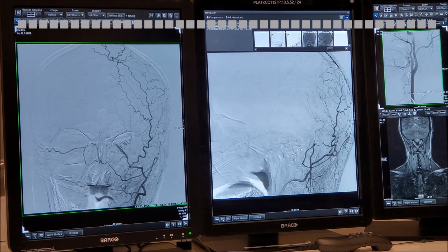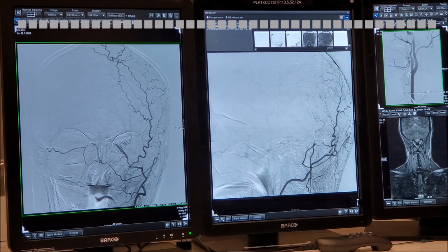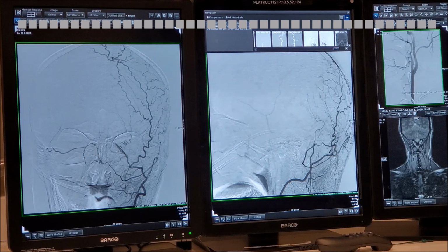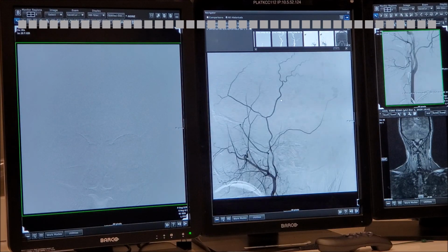Interesting, eh? This is quite a variant. Here you see the cutaneous branches, right? Same principle. It goes beyond the bone and becomes intertable, okay? It's dural and reaches the midline. Okay, so here, interesting variant. But there was the piece of the puzzle. We'll get back to the dural fistula itself in a second. We're just finishing the cartography.